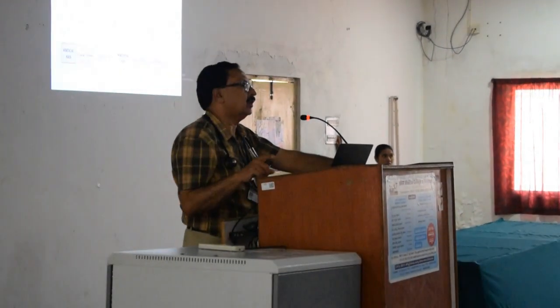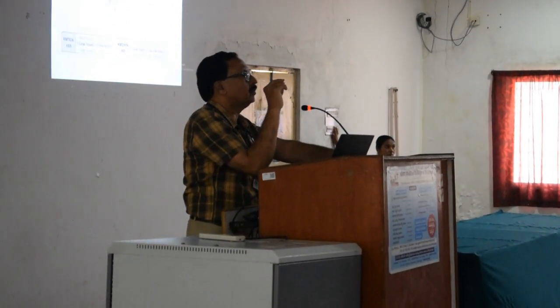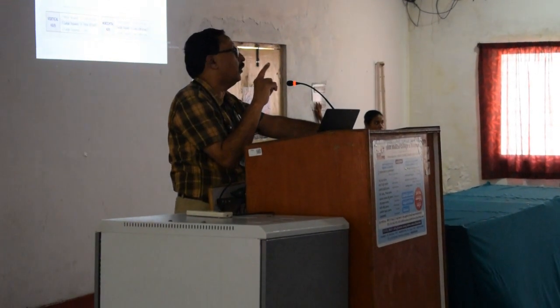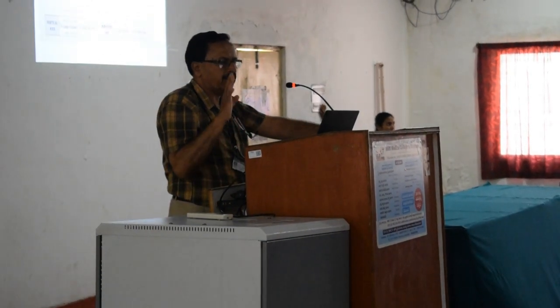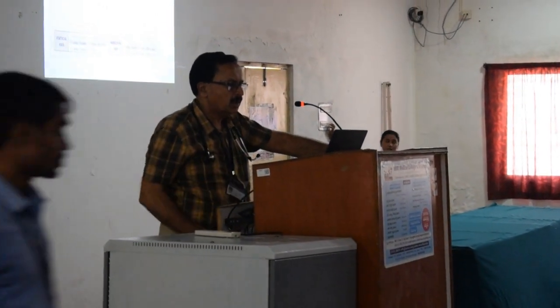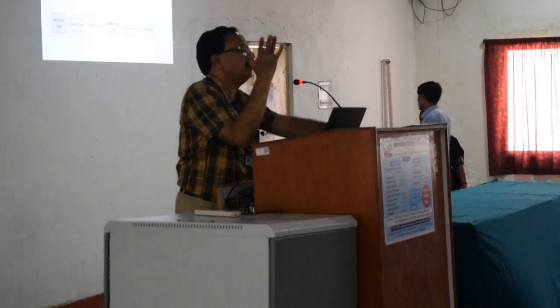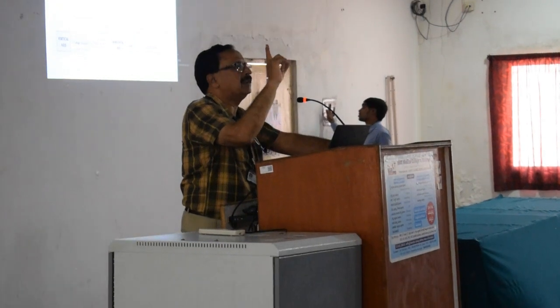axis. On the horizontal axis it displays the time. So therefore 1 small square is equal to 0.04, that is what I mentioned with the URS also. So 1 small square is equal to 0.04 seconds, and therefore 1 large square, that is 5 small squares, will equal 0.2, which is equal to 200 milliseconds, and therefore if you have 5 such large squares, you have 0.2 into 5, that will give you 1 second.